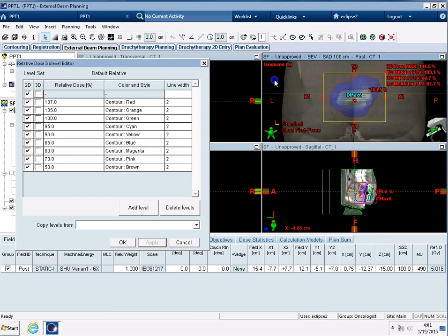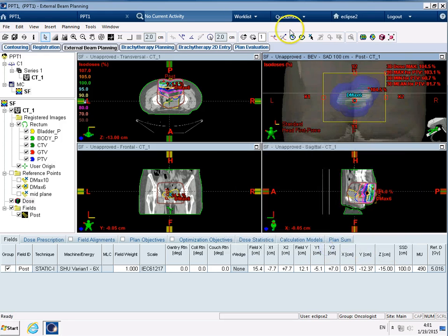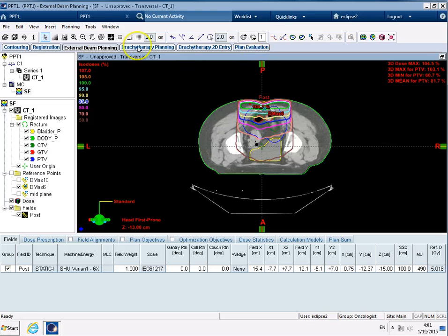They now disappear. And you can see here that we've got a number of isodoses displayed at 50%, 80%, 95%, and the different colours they relate to. We can add extra levels if we wanted, or remove levels, and similarly you can make the lines thicker or thinner by typing in a number there. So I could click 5 and that would make the lines ridiculously fat, and number 2 seems to be a pretty good happy medium there.